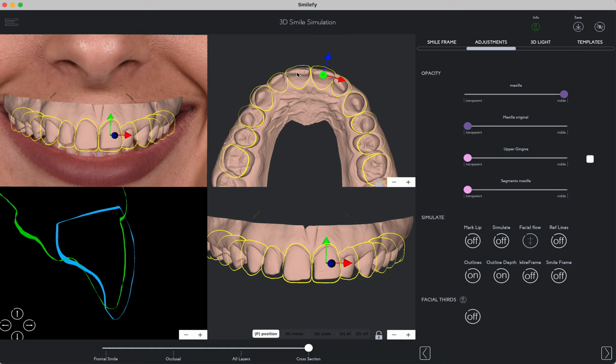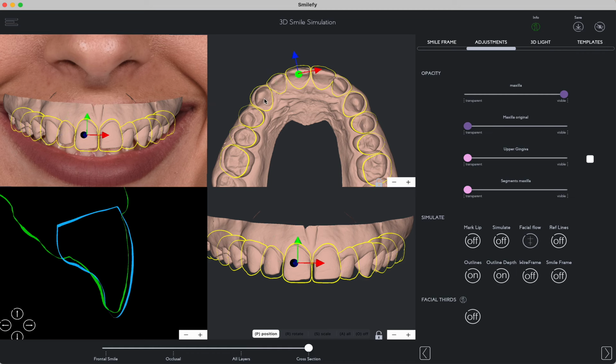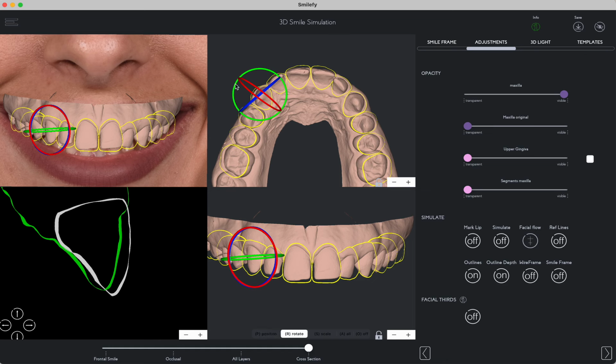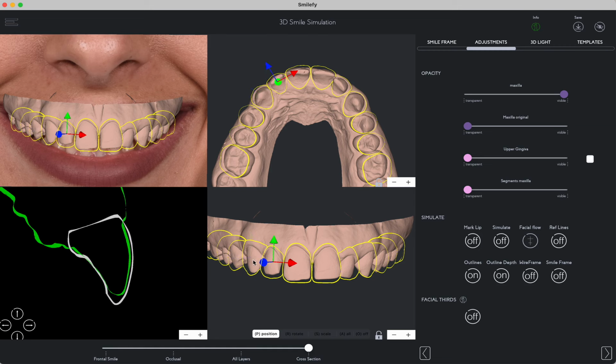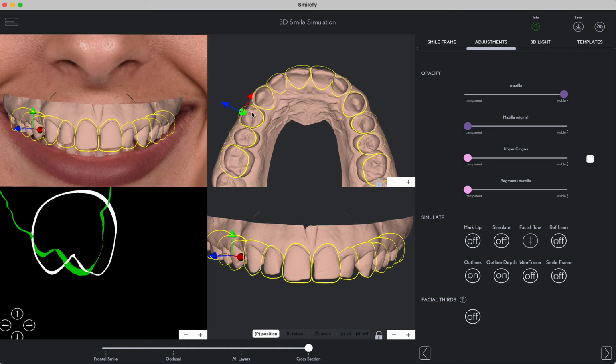And so designing, we get very, very deep insights of the issues of the patient. So I'm gonna now just follow the occlusal curve and the interproximal spaces and design the rest of my teeth. It's very, very easy and very quick because right now, seeing every single template from 3-4 perspectives, my smile design can be done very, very easily and very quick.